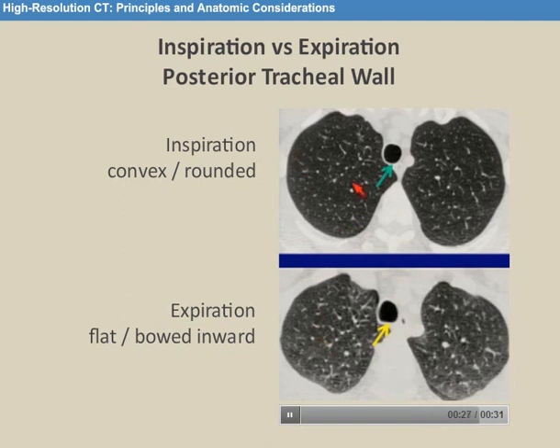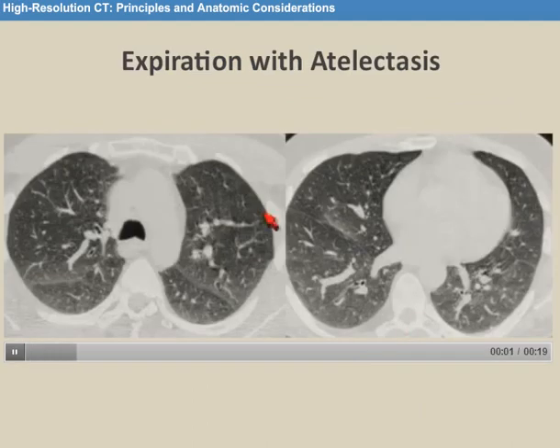And you can see that the lung itself becomes more dense and a little less beautiful on the expiratory image. You have to be careful because suppose that I didn't show you this upper image, I just showed you this lower image, you might be starting to call ground glass opacity here in this patient's both lungs, as you see here. But if you look at the upper image, you realize this was taken in expiration, and therefore this is likely to be artifactual ground glass, and you have to take that into consideration.